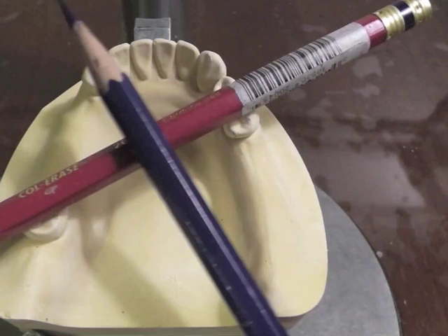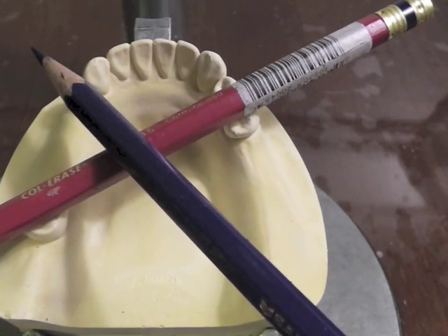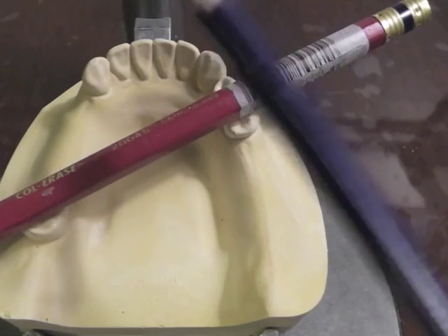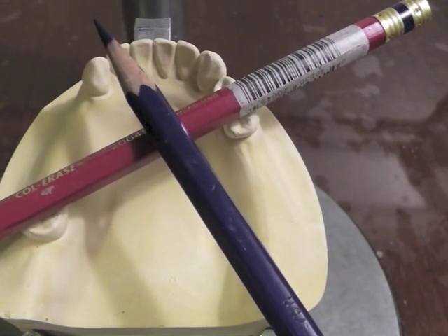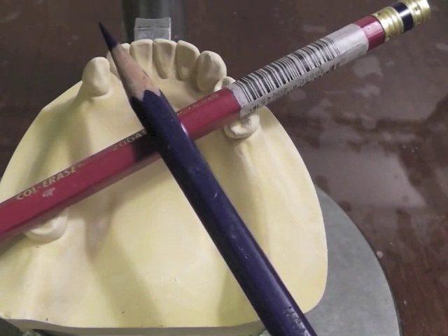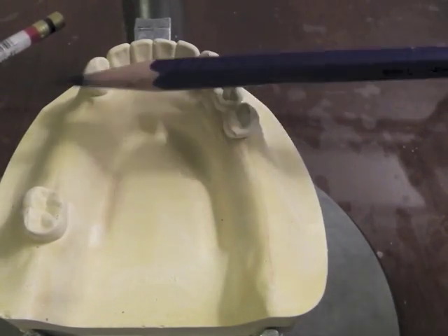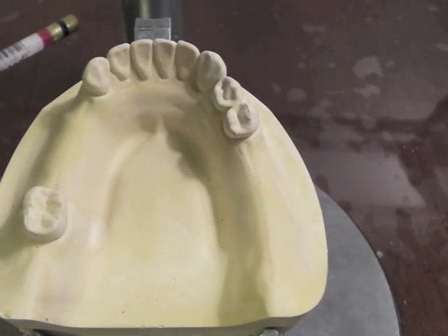When the patient eats sticky foods, that partial denture wants to rotate in an upward direction on that extension base side, and we will counteract that by placing an indirect retainer anterior to our fulcrum line on this partial denture design. So we have three teeth that will be clasped with our Kennedy Class 2. These are primary abutments. This is our secondary abutment.